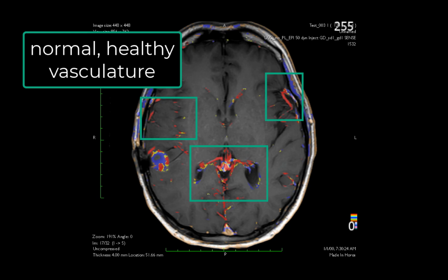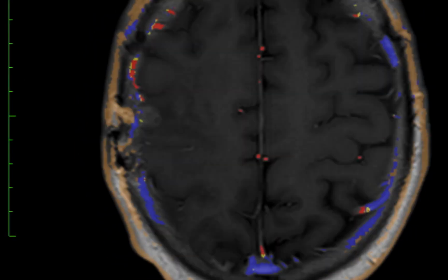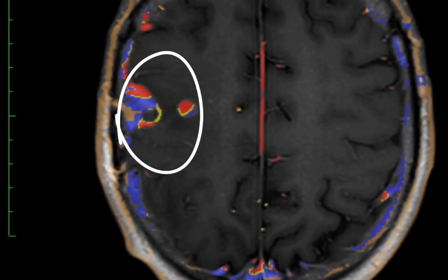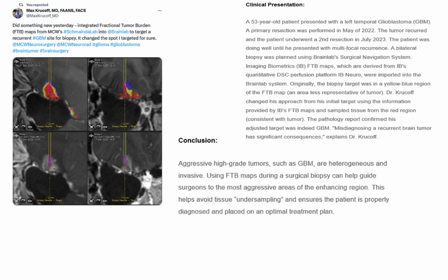However, some of the early feedback we received suggests that this is helpful and beneficial when doing diagnostic interpretation. But as you can clearly see, the same quantitative classifications within the enhancing region are there and provide the same benefits, such as guiding surgical biopsy, monitoring treatment response, and making visual interpretation much faster and more objective.